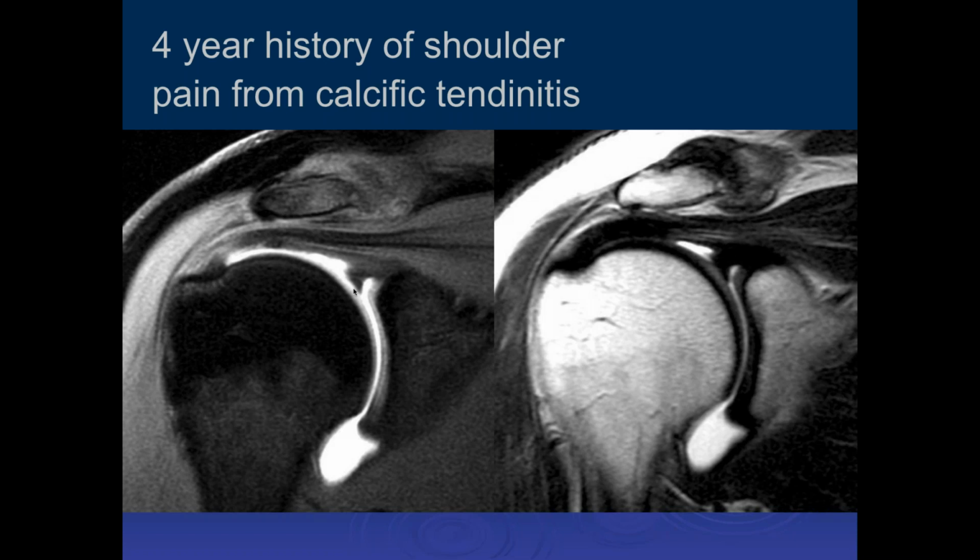We have the labrum here. And there have been studies looking at the distance here and how big a distance can be normal. Most papers show that there is no cutoff, not 2 millimeters like some people said to begin with. What you want to see is if you have any signal going into the labrum, that signifies a labral tear. If it's just at the base here and you have nice smooth margins, irrespective of the distance here, it should be called a superior recess.